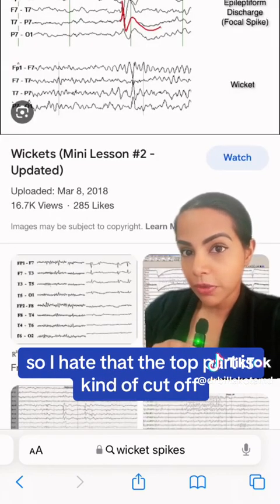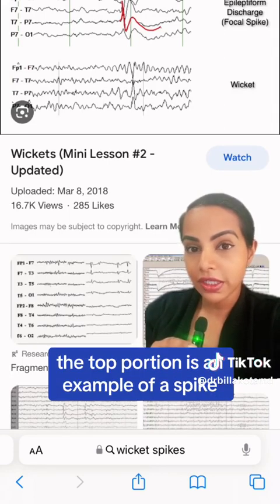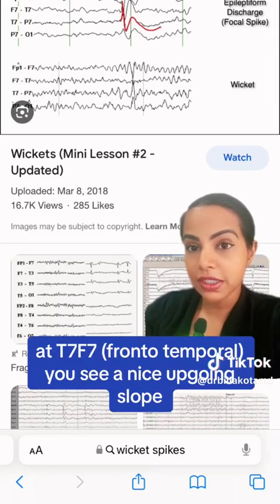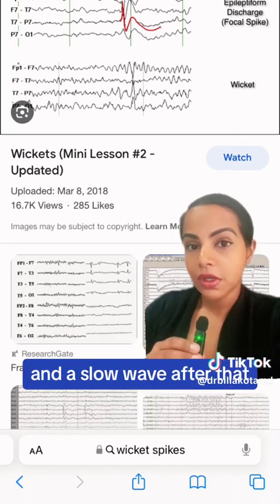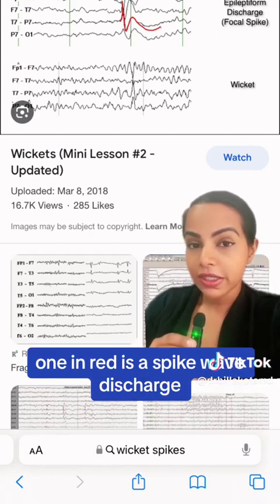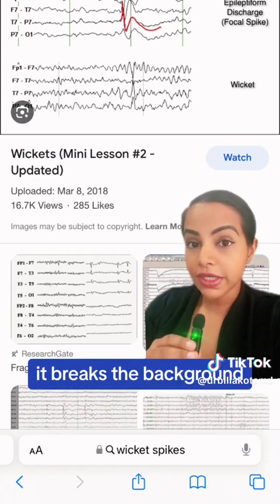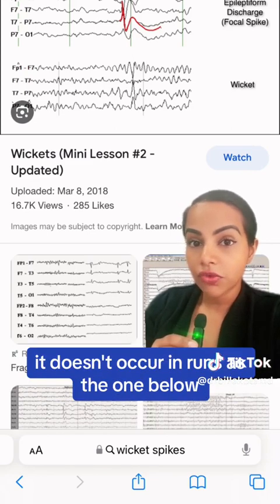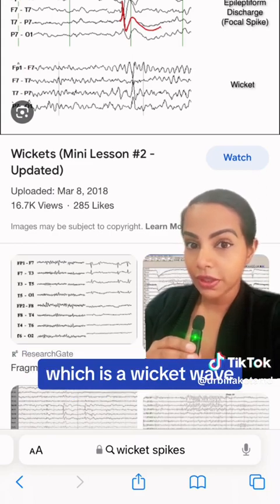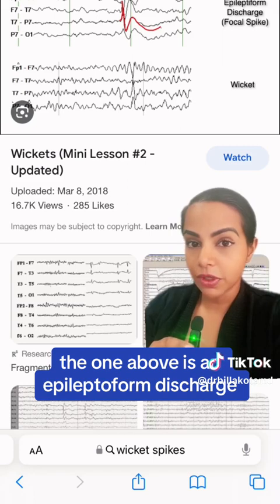I hate that the top part is kind of cut off, but as you see, the top portion is an example of a spike. At T7, F7, you see a nice upgoing slope, a downward slope, and a slow wave after. That one in red is a spike wave discharge. What separates it from wickets are as follows. It breaks the background, meaning it catches the eye. It doesn't occur in runs as the one below, which is a wicket wave. So the one below is a wicket wave. The one above is an epileptiform discharge.